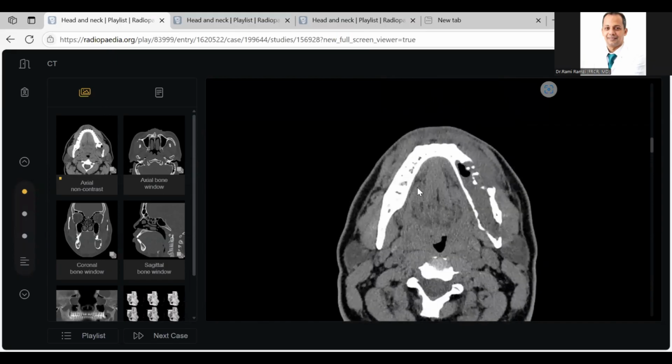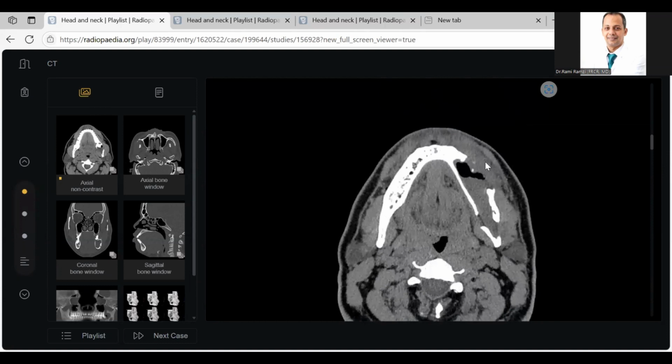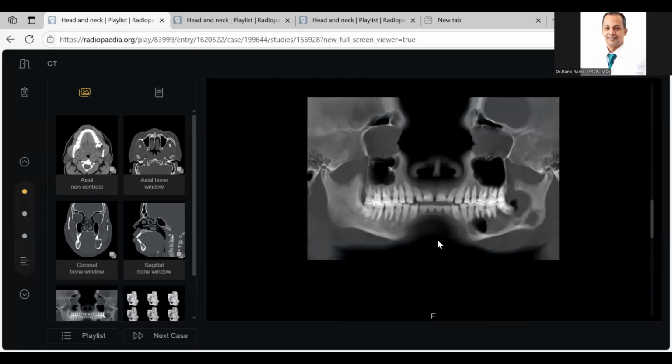If you look at the bone, this is a lytic lesion, and there is some breach and destruction here. Osteonecrosis has a characteristic nature of avascular necrosis and bone sclerosis, alternating bone sclerosis with bone lucency, like this.